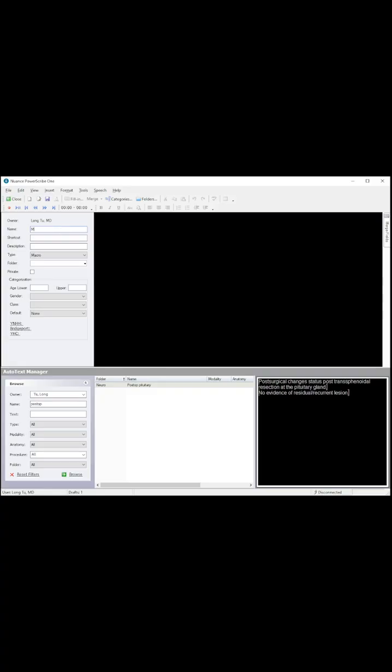This is going to be MR post-op pituitary. Again, if I turn this to template, I could designate this as a template, but actually for all my templates, I just keep the type as macro. With template, I can't remember all of the nuances here, but I believe you have special considerations, ways you can associate it with exam types.